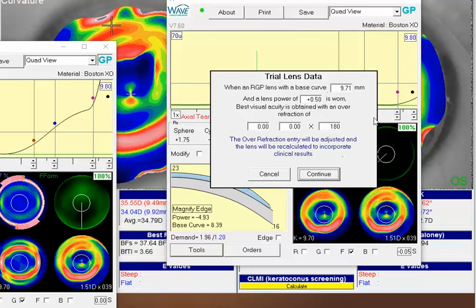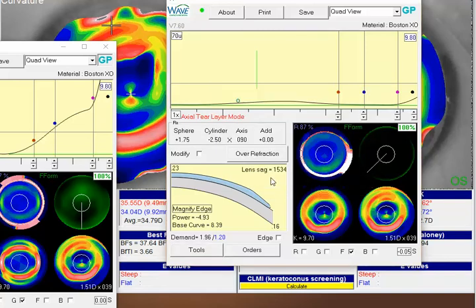And what I find is this little helpful tool will help you get from point A to point B a little bit more efficiently. As you know, this Wave uses very complicated optics and calculations to come up with your final lens power, and sometimes having just a simple basic lens reference can be very helpful in getting you closer to that endpoint. Now, in your case, if you don't have that data, well, actually, you kind of do have that data. So if we go over to your left lens, I'm going to pull that one up here for a minute if I can find it.